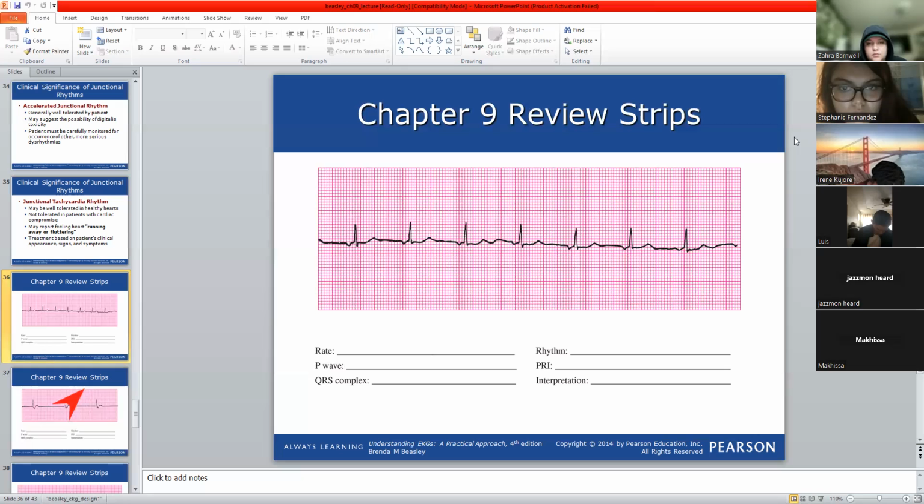We have Oakland, we have San Francisco, we can measure the distance. But if I ask you, what is the distance between San Francisco and a fake name? The fake name is not present. You can't get the number. Here, we have both P and R. So you count the distance and let us know.